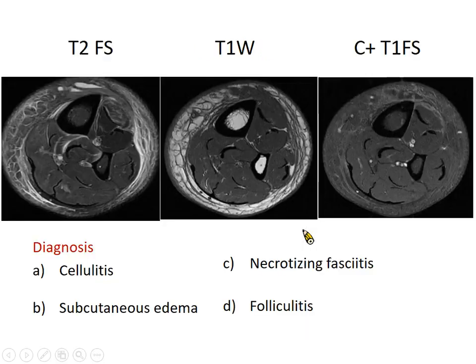So here's the MR imaging, T2 weighted, T1 and with Gad. So here we can see all the soft tissue changes, but more importantly, very eye-catching lesions that we can see between the muscle all the way around the joint, right here.